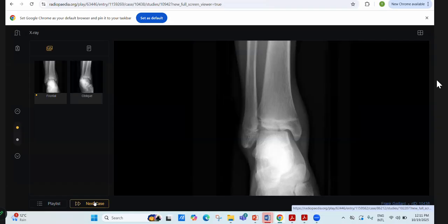One other sentence maybe, patient is young with... sorry. Yeah, okay, go ahead. This is the X-ray of the same patient. No, no, no, you go ahead with your last sentence about that case, and then we'll move on and discuss it later.